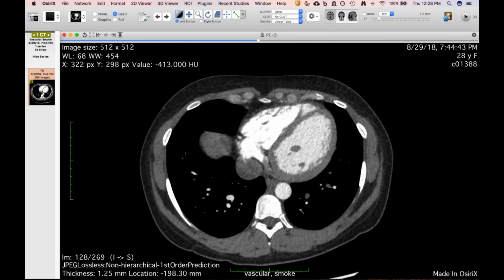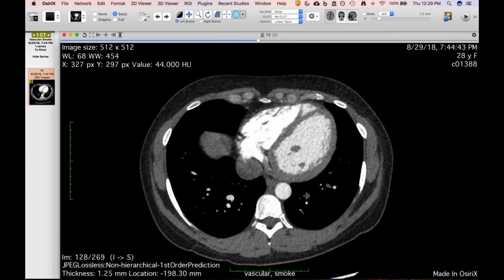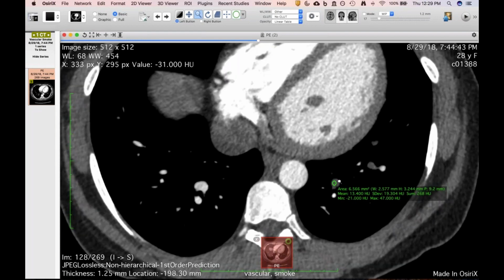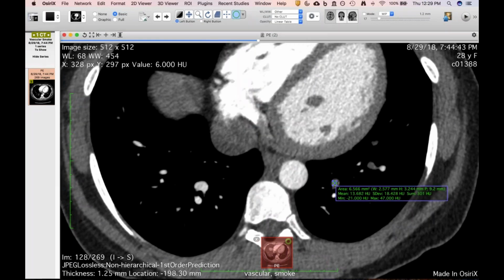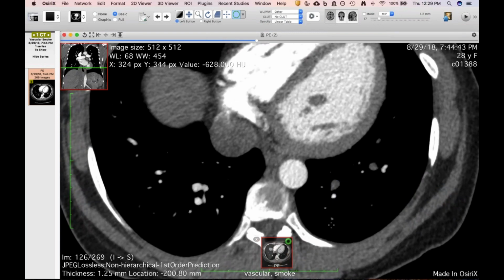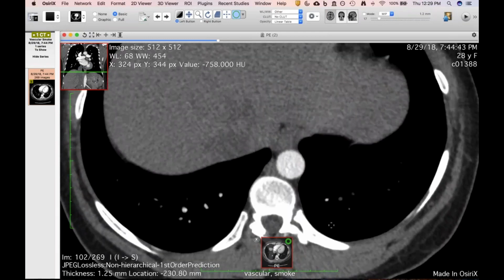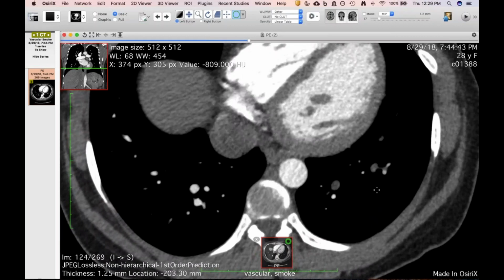And if you put a Hounsfield region of interest on this, it's like 20 Hounsfield units. So I have no idea if this is slow flow and just smoke, or if there could be associated thrombus that's formed in the pulmonary veins as a result of the slow flow, or as a result of the upstream obstruction.